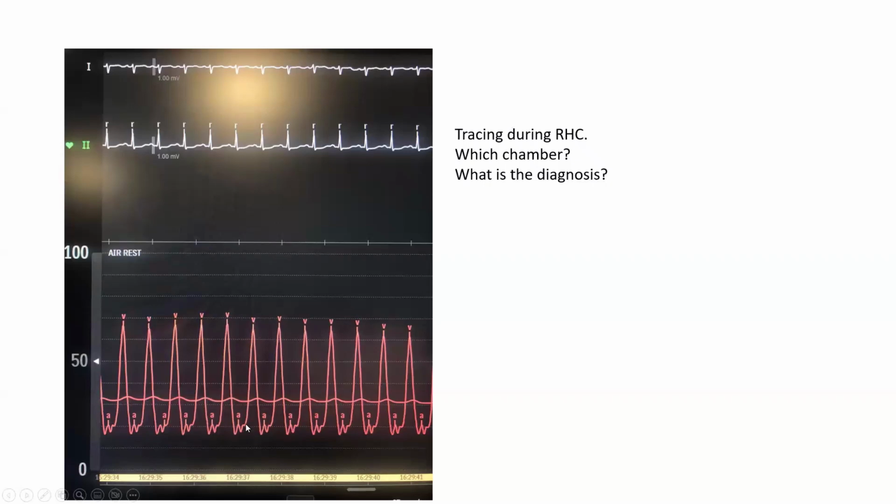And the PA tends to have a sharp upslope with a slower downslope with a dicrotic notch. Whereas the V wave of a high wedge pressure will be peaky, narrow like this, peaking after the T wave. So for those reasons, whether the morphology of the peak, the narrow peaky morphology, or the morphology in between the peaks, suggests this is definitely not PA.